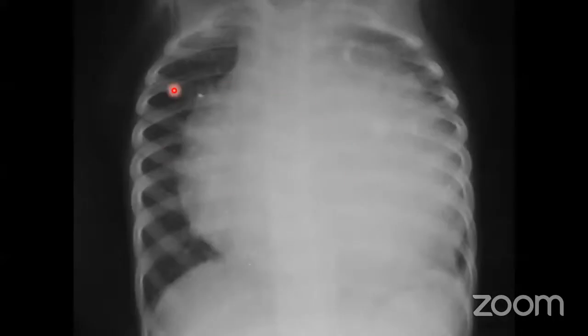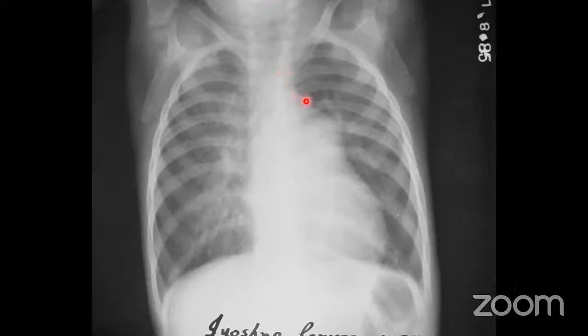Here also, this is a huge cardiomegaly. The pedicle is not so narrow, but the cardiac configuration is not normal. So it is a hypertrophic cardiomyopathy. Here on the left side, you can see a bulge over there. So it must be a pulmonary hypertension. On the right side, you can see much of the pulmonary plethora. So this is the pulmonary conus bulge, and this is the right side. You can see a lot of vascularity over there. So this must be a case of pulmonary hypertension.